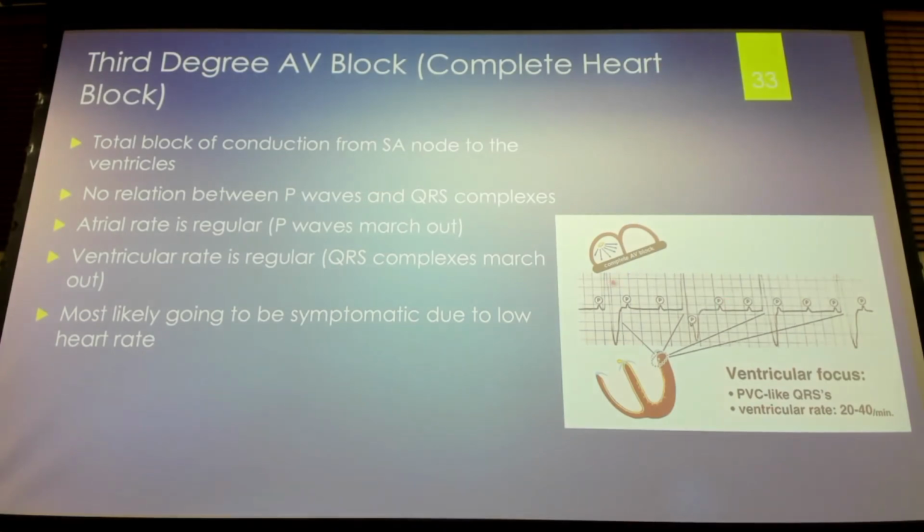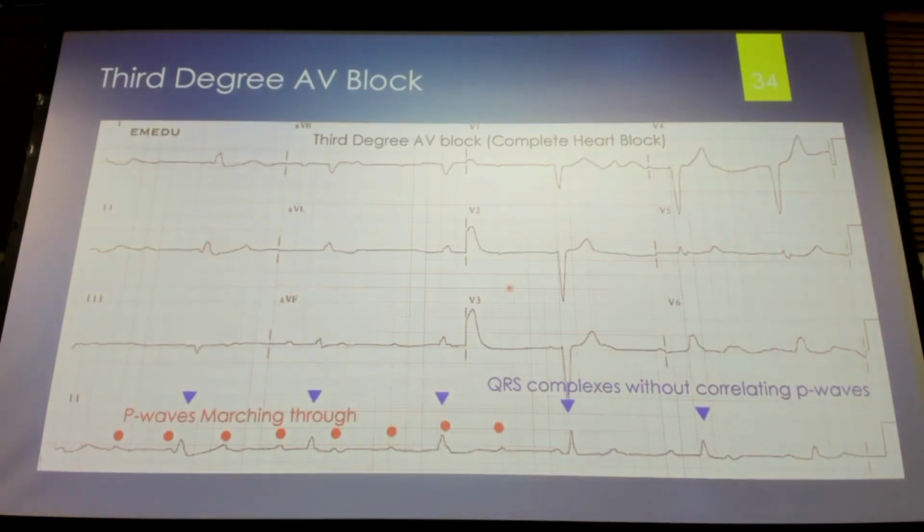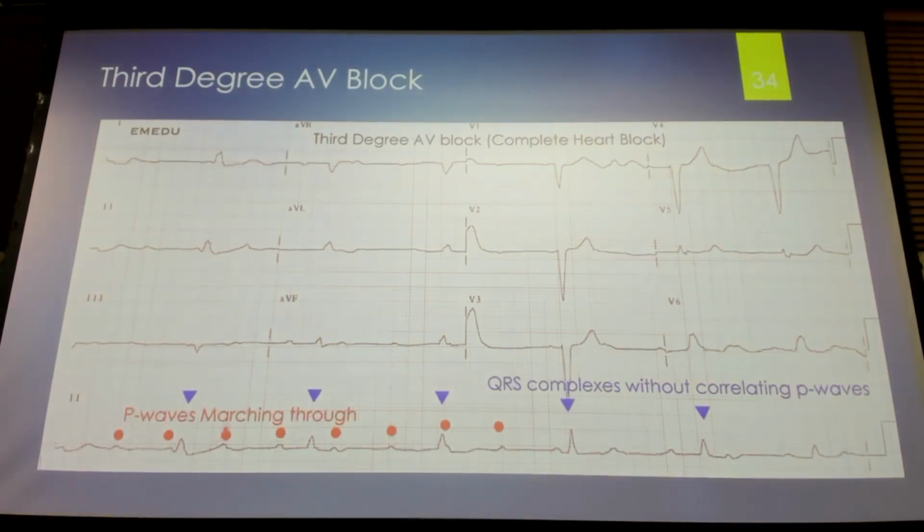Okay, our QRS complex, we have Q here, here, here, here. If you just look at those QRS complexes, what do they look like? Okay, regular rhythms. They look regular because the ventricles are doing their job. They're pushing out this regular pacemaker responsibility, but they don't know that the atria are also firing. So they're working independent of each other.